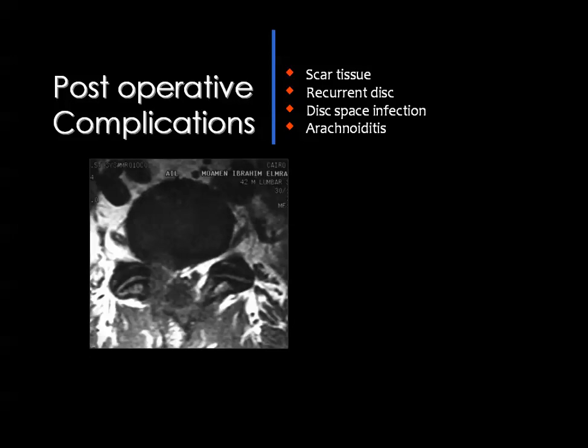And then the post-operative scan for this patient, and you can see that there is surgery here, and this is the thecal sac, and this is the nerve root surrounded by epidural fat on the normal left side. But at the site of surgery, you cannot see the nerve root, and you see a shadow which may represent a post-operative scar or a disc herniation or both.